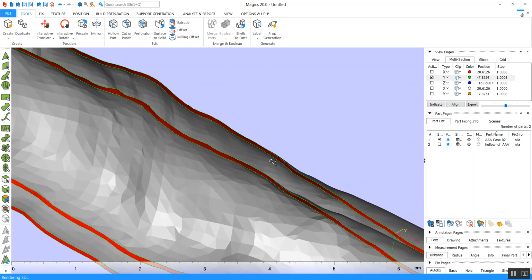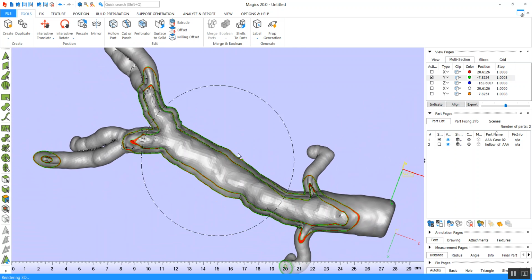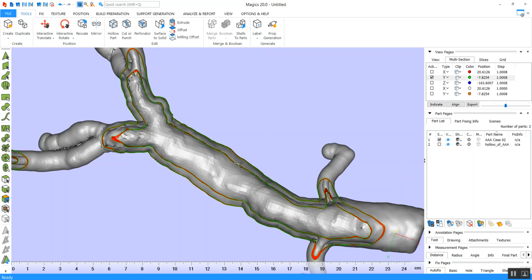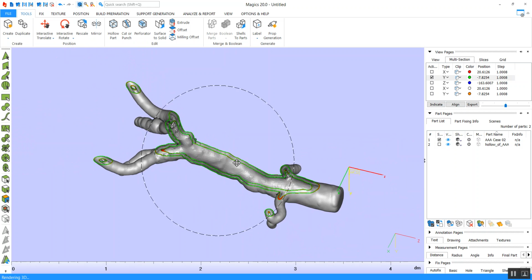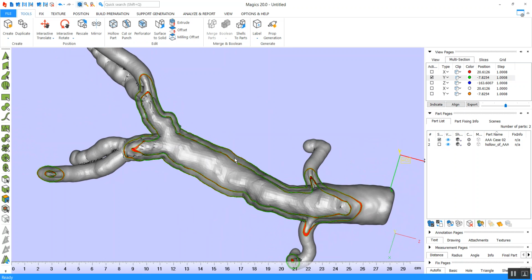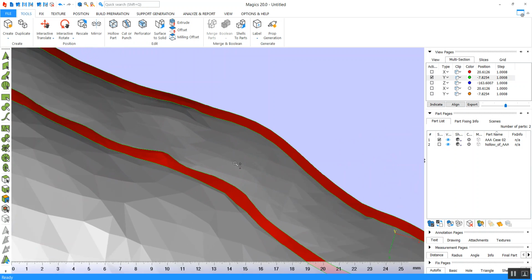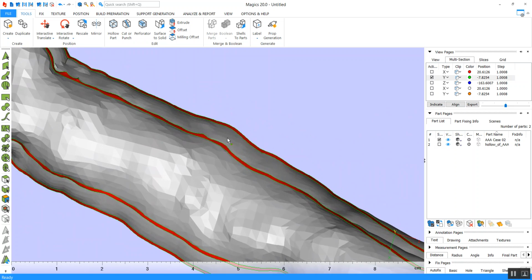And so basically the way this works is the next step is you're going to then add vents and sprues wherever best you think geometry can add, like wherever best you have oriented your part and then where you think the air bubbles may catch. In this case I have not done yet, I will just pause the video here, but the idea is to fill this middle cavity here with silicone, and then you'll later break it off.